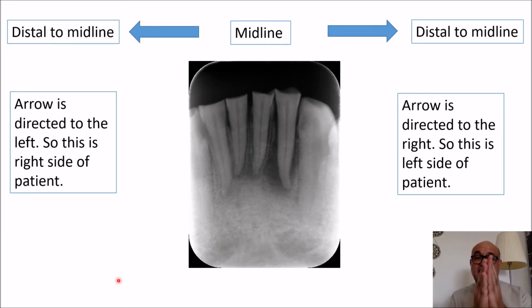Okay, so you look at the radiograph, you draw a line and see where the line is going in a distal direction. And then you reverse the side. Before I leave this slide, how do I know that this is a lower central incisor? From the teeth, right? And if the teeth are not present, I will go to the lingual foramen or lingual pit, the mental ridge, and the mental fossa over here. So this area is for the mandible.